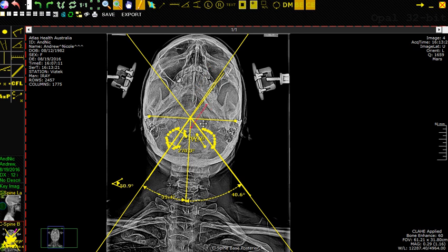Now what I'm going to do, and here's where it gets tricky, is okay, we want it most lateral, yeah, right about there, and then extend it out this way. Now you can see how suddenly I have to start guessing, okay, well, is it here, is it here, trying to keep it as parallel as I can. Let's say it's right there. Now the tricky part is, okay, now I need to grab it on the other side and pull it up this way because I don't want it obstructing the rest of my view.